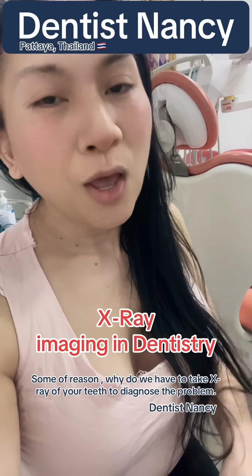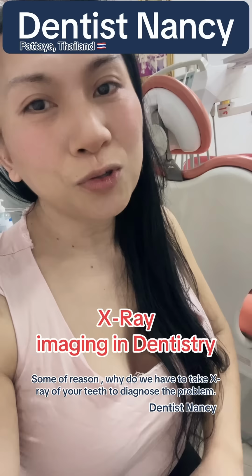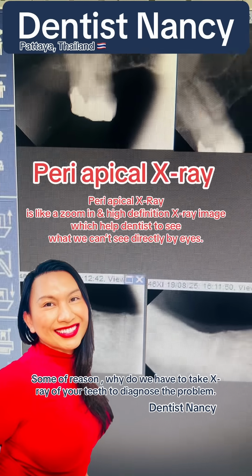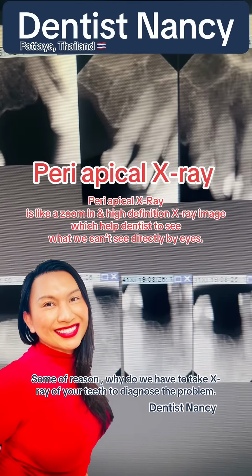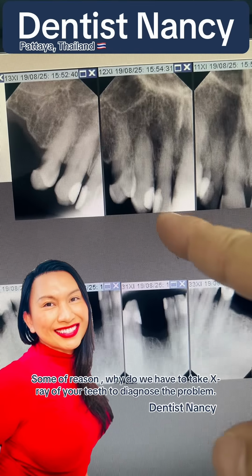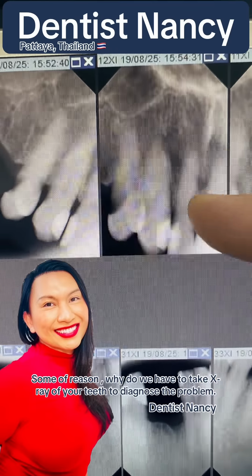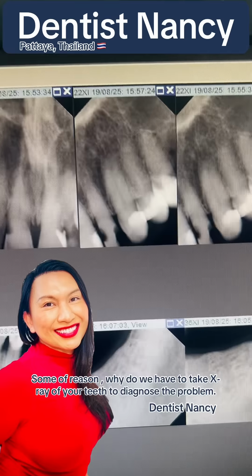X-ray in dentistry. Why do we have to take X-rays of your teeth when you come for a checkup? Now I'll show you. This is what is called a periapical X-ray. It is the X-ray that we use to check each individual tooth very carefully and thoroughly. We have to see the tooth, root canal, the bone around the tooth, periodontal ligament space, and any lesion around the tooth. This is what we check.